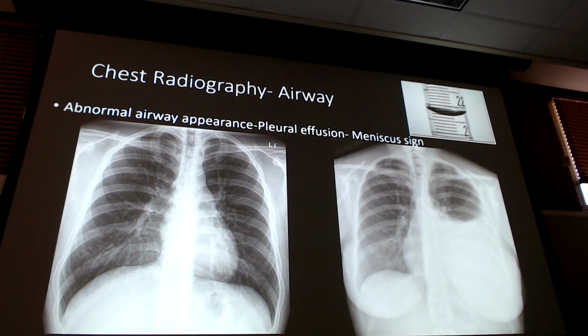The fluid is sitting in a tubular area, right, the thorax, and it comes up and you have a meniscus sign. Now, usually you only see this on the ones that are pretty severe, that have a lot of fluid in there, because I got to be able to fill up the whole side of the thorax, and then you can see it. You don't usually see it when it's just a little bit down in here, because there's not enough yet to really create that full-on meniscus sign from basically the mediastinum over into the wall of the thorax.